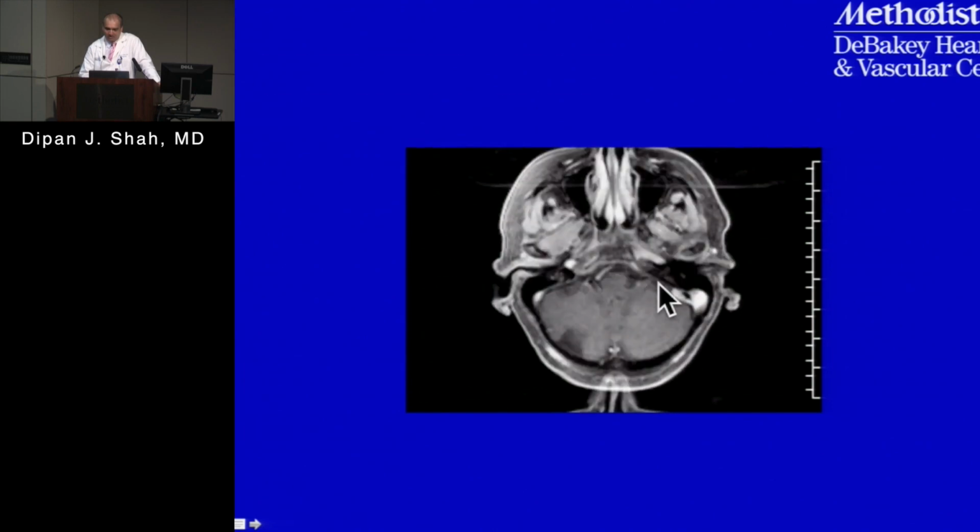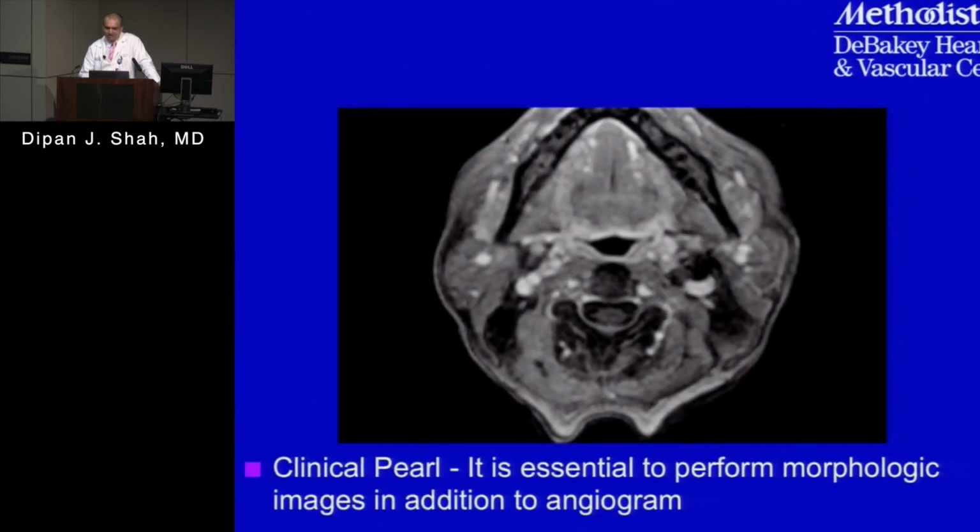right? No, this is just metal artifact. Remember, the person had a prior carotid endarterectomy, so sometimes they put some little clips in there. So this is just metal artifact which is protruding into the vessel, all right?